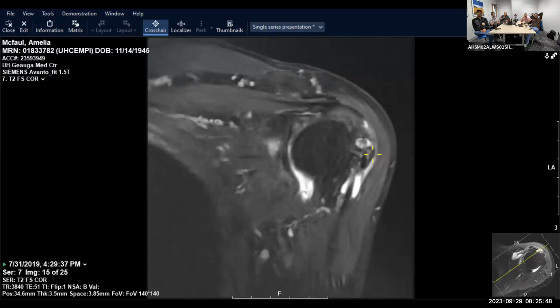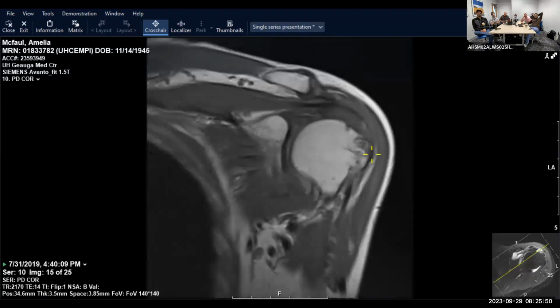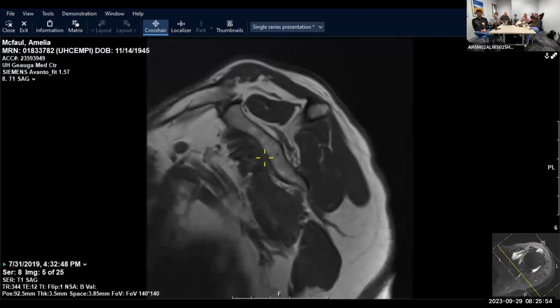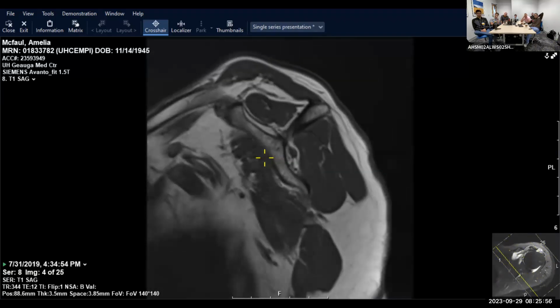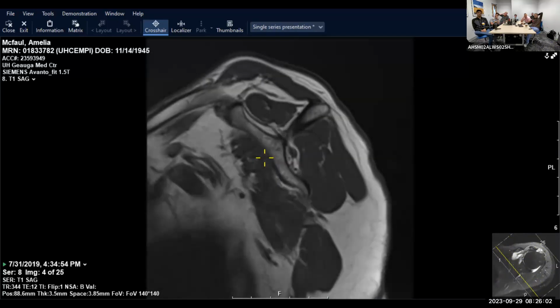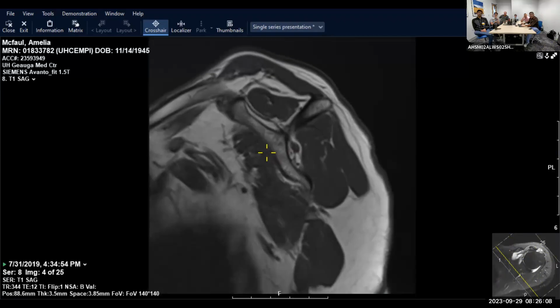Okay, so what I'll do now, also the sagittal plane T1s, important for muscle atrophy, right? So muscle atrophy is a big prognostic indicator for cuff repair outcomes. And so we have our tangent line sign where you see the base of your coracoid and your acromion. If you draw a line from here to here, your supraspinatus should fill that fossa.